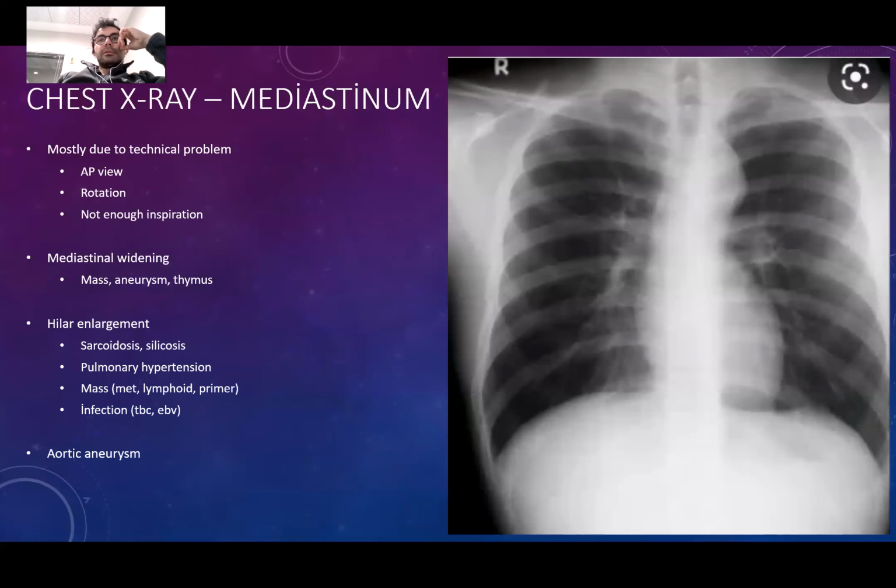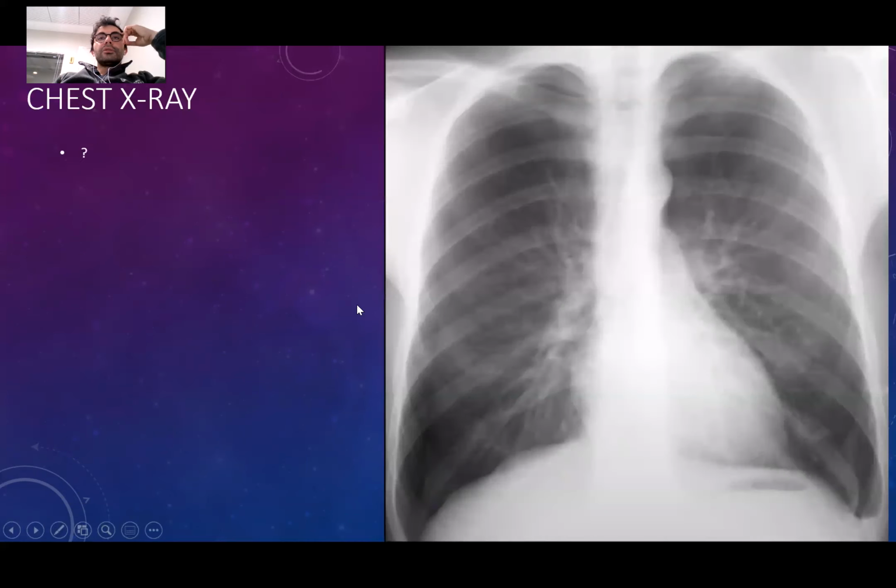We have talked about mediastinum. This is a young patient, and the aorta is very prominent. The heart is not. So when I evaluate this image, if this was a very big heart, this image could be okay. But with this small heart, young patient, and a big aorta, we should always be suspicious about a mass lesion in the mediastinum or an aortic aneurysm. It can happen with young people as well, right? So you should always look at the age of the patients.